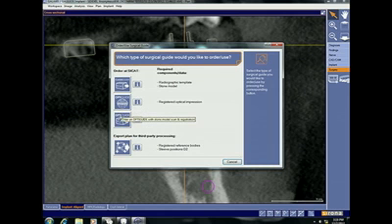And we can also still do the OptiGuide without having to take an optical impression, but in this case you would have to send a stone model. And last but not least, the third-party processing, as you see here with this giant R, is meant for an exportation of the reference body so that the CEREC can actually mill that component for the CEREC guide process.